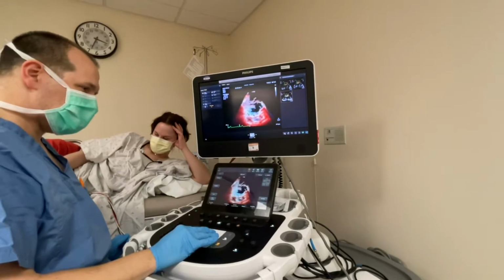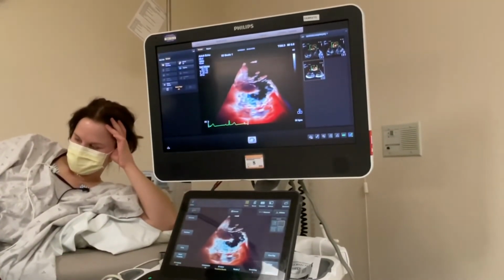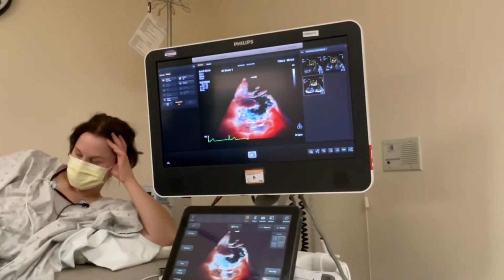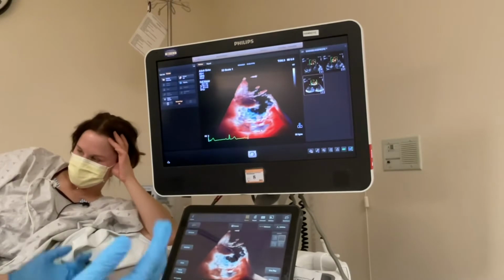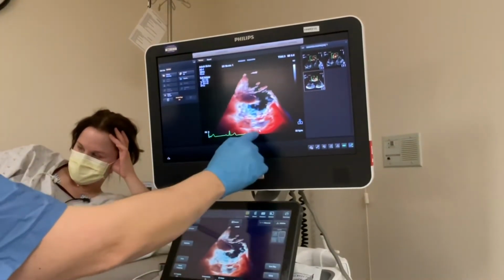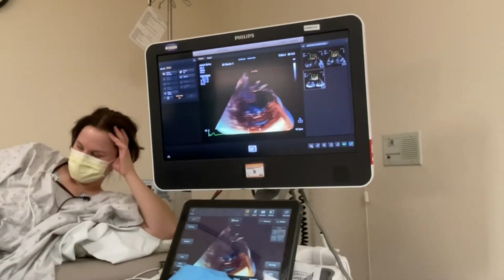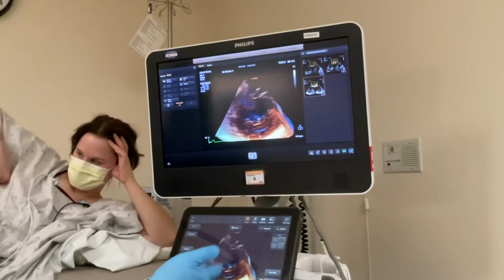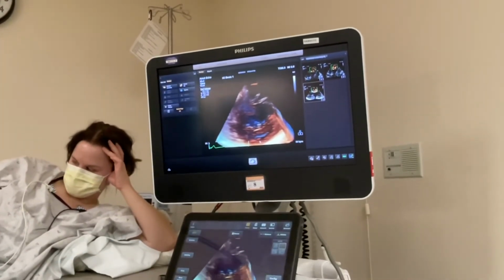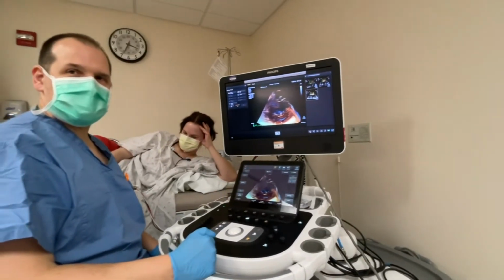we can scroll back and see up here. So you can see the annulus fairly clearly if, for example, we had to measure that, just following the arrow or the finger, this segment here, where with the regular 3D depth color, it's not as clear. So it's just another tool in the toolbox to help you make better measurements and get better decisions and better outcomes.